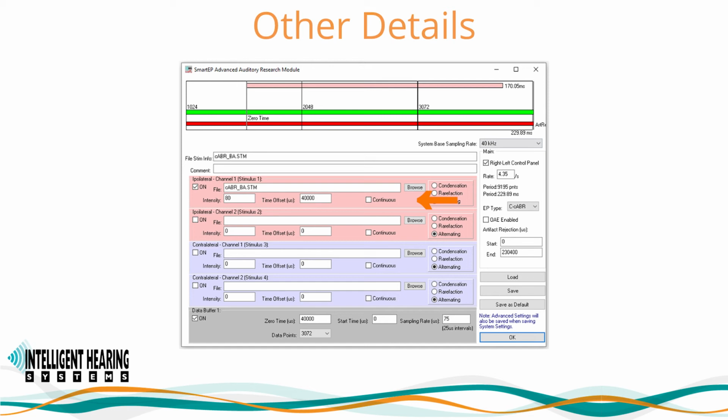When using this option, make sure that the start and end of the stimuli are matched to the same level or zero. Otherwise, an unwanted click might occur at the start of each play loop. When using the stimulus generation utility, make sure to activate the overlap window for continuous output option. Up to 2 stimuli per side can be activated for units with a built-in channel mixer, as discussed previously when presenting ipsilateral noise or babble. Any overlap of the signals will be mixed by the hardware.